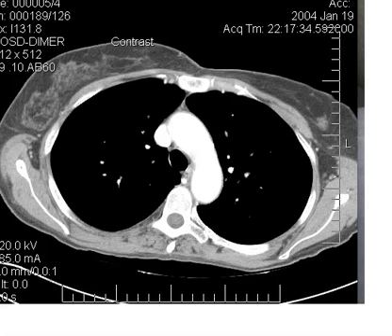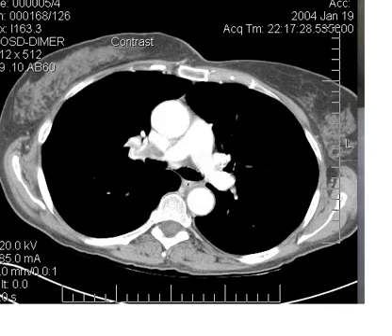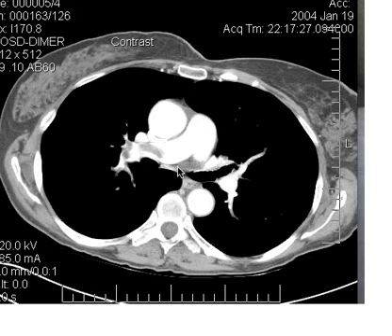So if we go below that, we should then come into the branching of the pulmonary artery. And indeed, here you have the main pulmonary artery coming in and branching to the right and the left. Now you can clearly see that there's a filling defect right in the right main pulmonary artery, and that's because it is getting lodged at the branch point, where of course the pulmonary arteries reduce their caliber, and that's why they get lodged at this location.